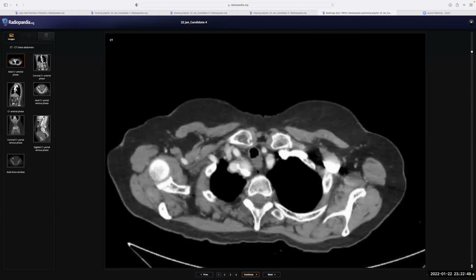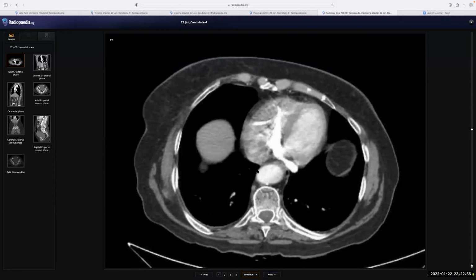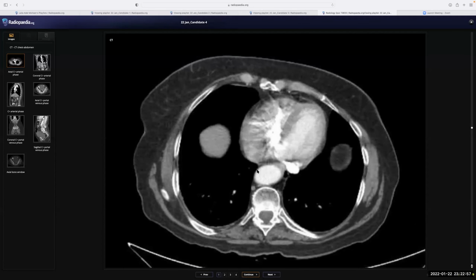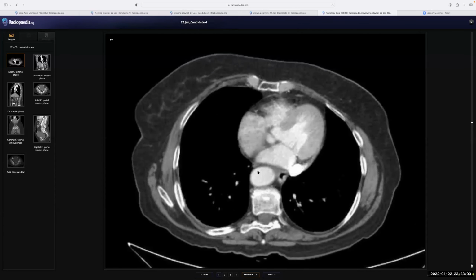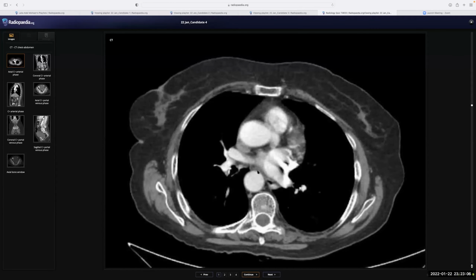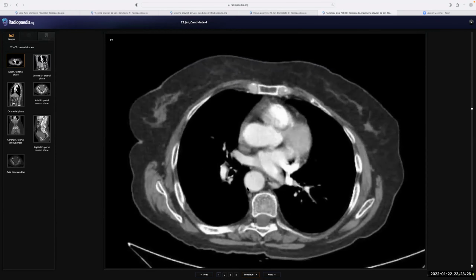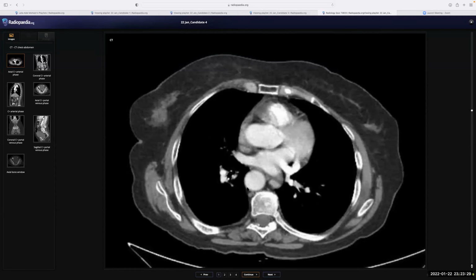So you are suspecting it is a metastatic deposit. In any other possibility, the sacrum? The other possibility could be a chondrosarcoma, but the matrix doesn't appear like that. And the other possibility can be a plasmacytoma. I'm looking at the breasts, but I'm not able to see any characteristic mass lesion.